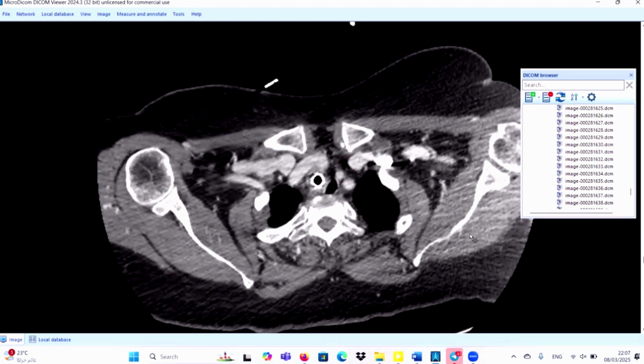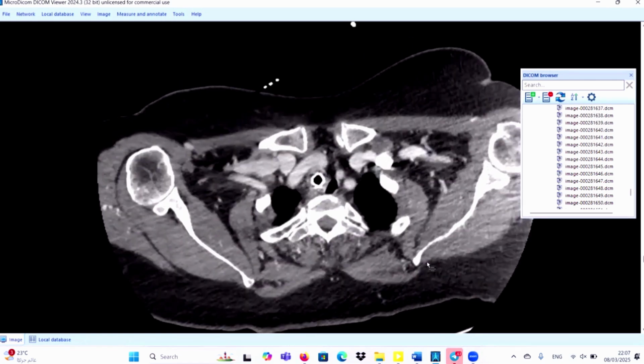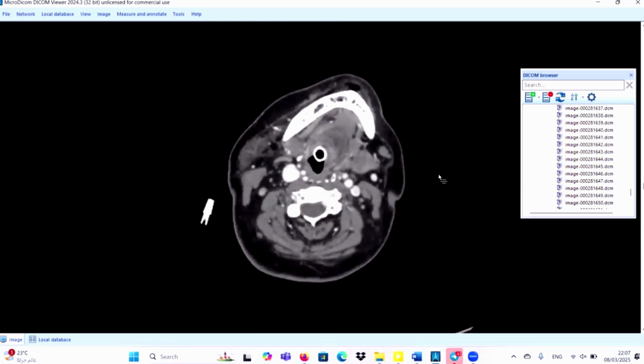We don't have any condensed contrast along the left subclavian vein, but we are still having some beam hardening artifact along the thoracic inlet, as you see here, these fine lines. But really, it doesn't affect the image too much. And we don't have any significant stenotic lesions along the left common carotid artery. So checking the second run is helpful in this case.